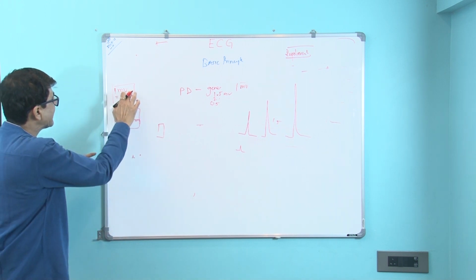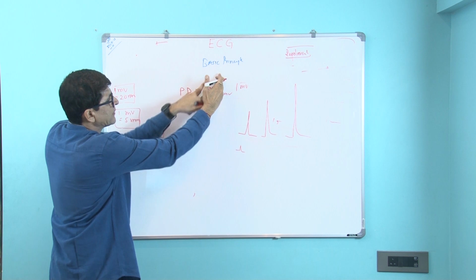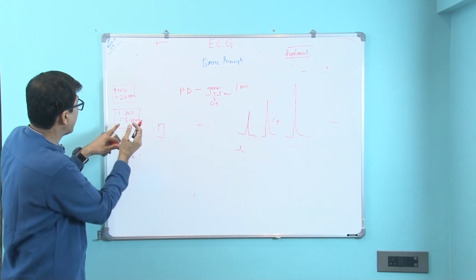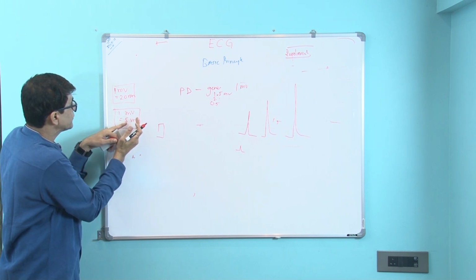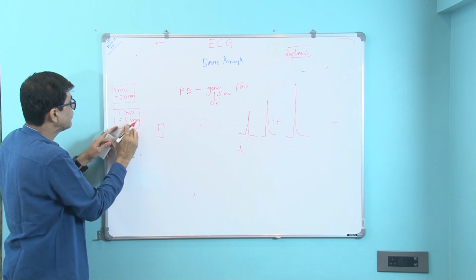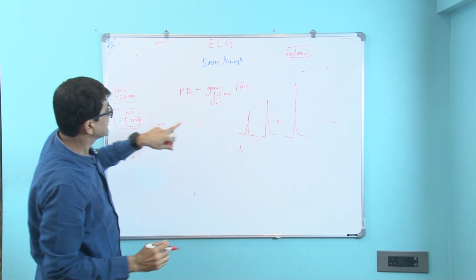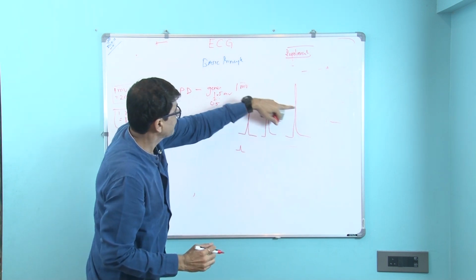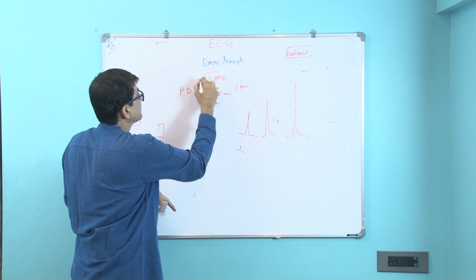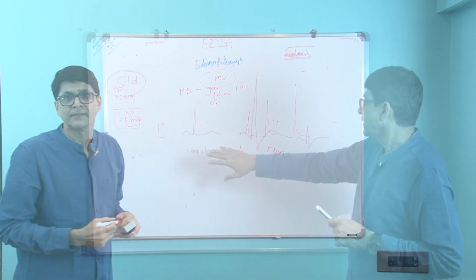If you press this switch, when the potential difference is 1 millivolt, it will record 20 millimeter deflection directly. And when the complexes are coming very big, then you reduce it to half. Then if the potential difference generated is 1 millivolt, it will record only 5 millimeter deflection.